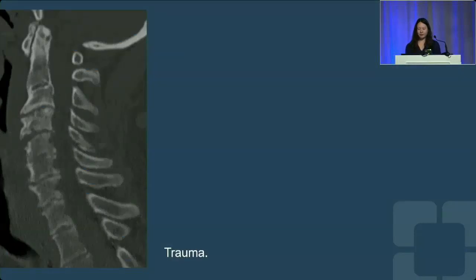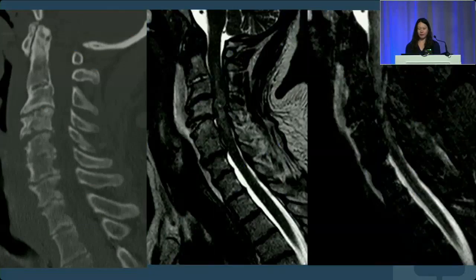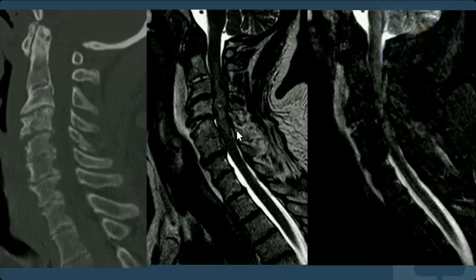Here's a trauma case related to looking for alignment. So here there is very subtle widening of the disc space anteriorly, and it takes very subtle findings to call and kind of warrants further imaging, like an MRI. And this is why, because this patient has a tear of the anterior longitudinal ligament with this effusion in the prevertebral soft tissues. And also, they have cord injury, cord contusion.